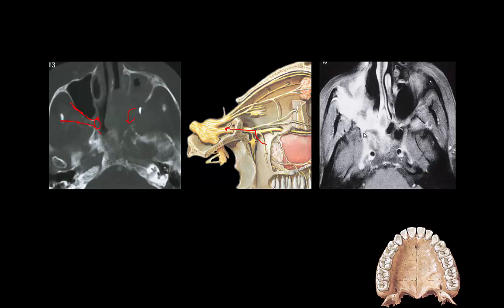Years ago, when we would show this, at least there was some skepticism amongst our skull-base surgeons. They would say, well, you know, I'm not sure if I believe that. But now I think over the last 20 years or so, there is great acceptance that radiologically we can detect these. In fact, the radiological findings oftentimes precede the clinical findings. So if we show this now, oftentimes these patients will be treated with chemotherapy and radiation therapy.